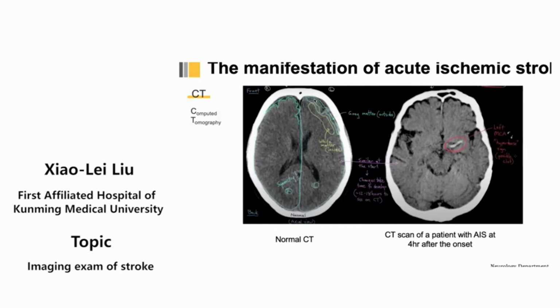The edges, the surface of the brain look a little different from just below the surface. It is a reflection of the gray matter. The gray matter is on the outside of the brain here, and the white matter on the inner part here. All of them are white matter inside the inner part of the brain. And one more thing I might mention is that this normal brain looks symmetrical.